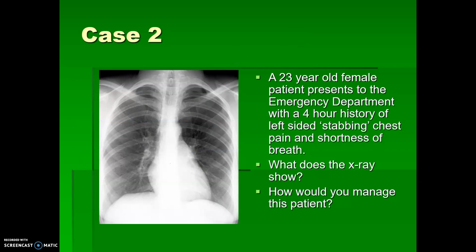The second case is a 23-year-old female with a 4-hour history of left-sided stabbing chest pain and shortness of breath. This is quite subtle, but can you see what this x-ray shows? And how would you manage this patient? Again, pause the video.